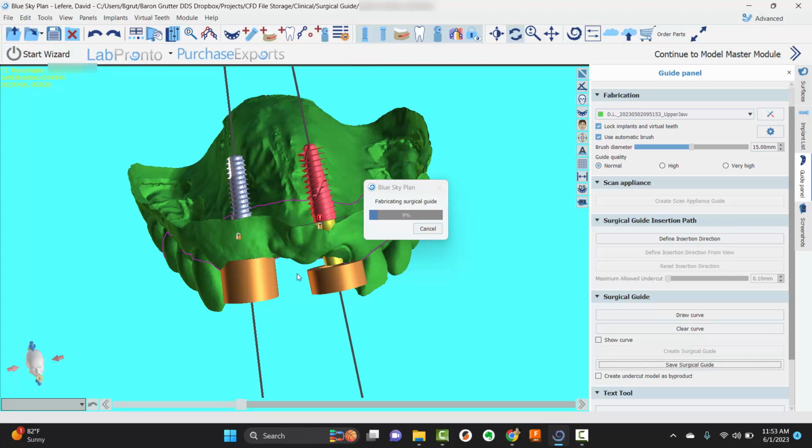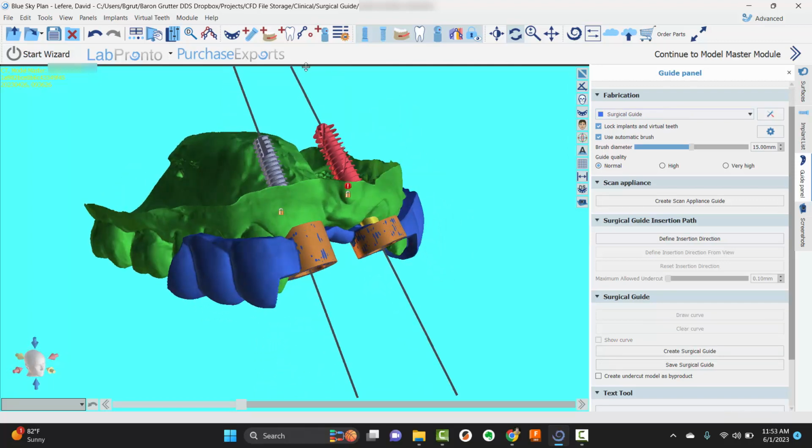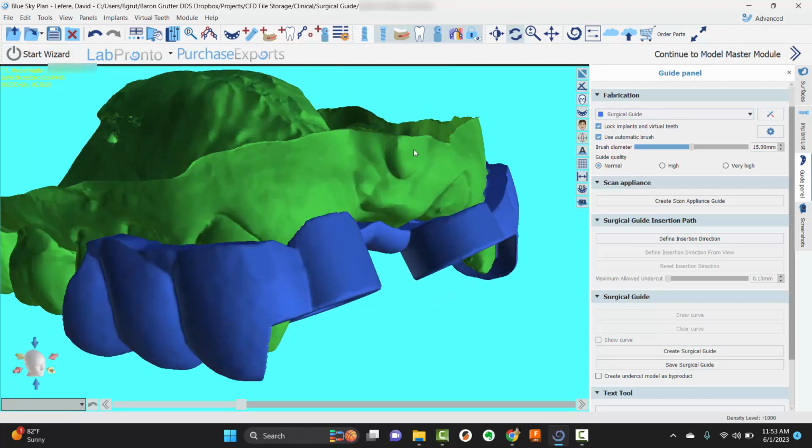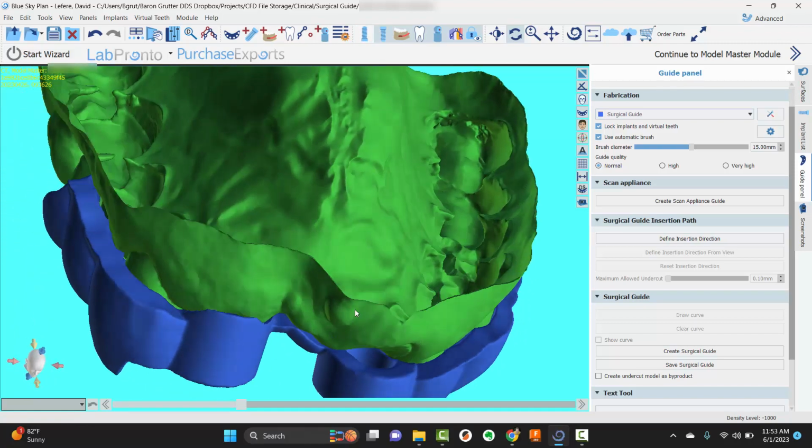What's going to be most important is this apex of the implant is going to want to come towards me, in the 3 dimensions. It's going to want to come more buccally because it's fighting that palatal wall, which means that right down here is where the guide is going to be getting pressure right along the apical aspect of this tube. So if we leave the guide tubes high and just leave them be, let's just turn these off for a moment, you'll see we're missing an opportunity here where we could have some more trajectory control.